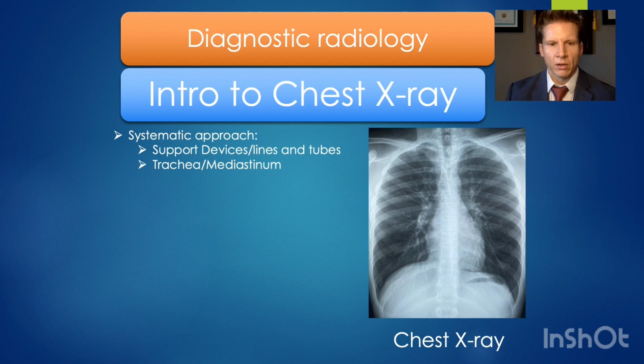Again, you want to take a look at the mediastinal borders, the overall size of the heart, which should be about 50% of the size of the thoracic cavity from pleura to pleura, so that's the cardiothoracic ratio, which should be about 0.5. You want to have a good appreciation for the hila and take a look at the AP window.